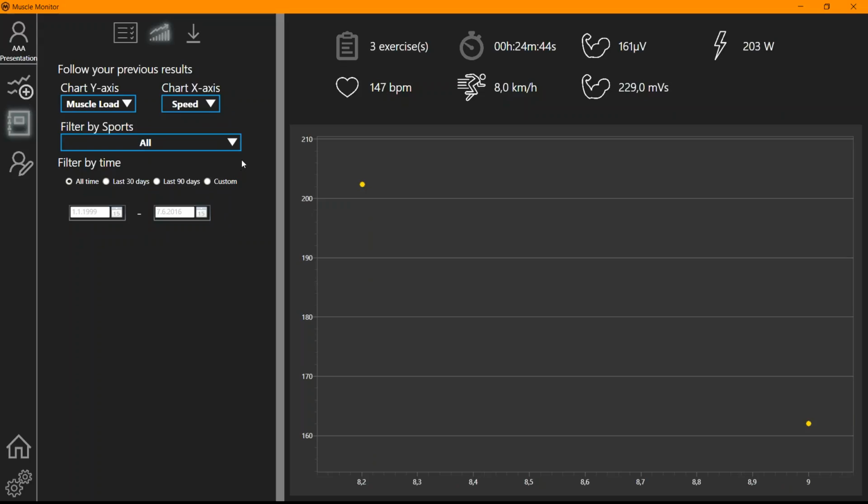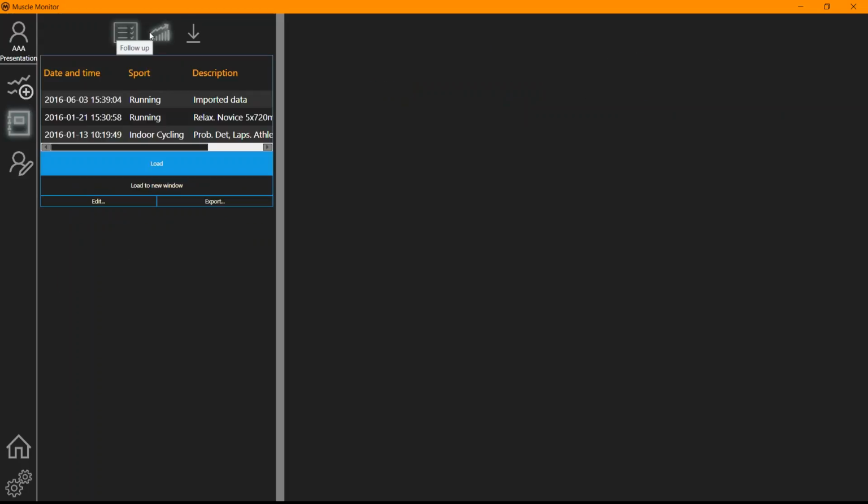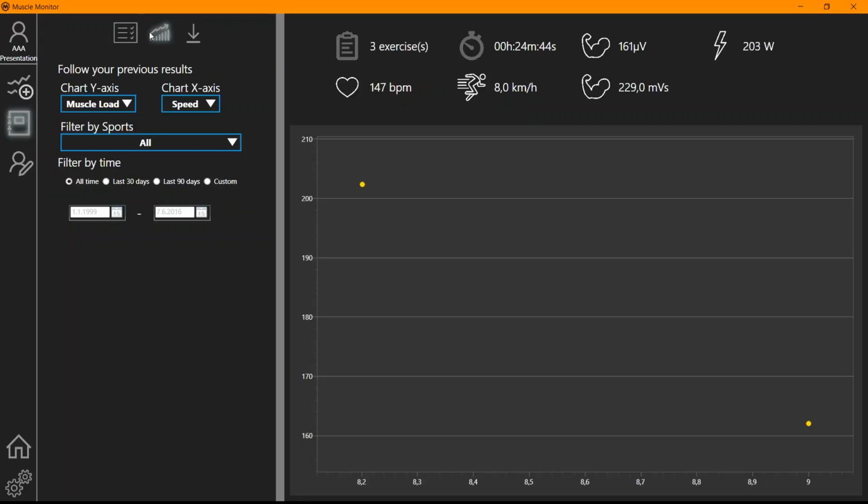Yeah, the database isn't very good to show this feature nicely, but if you have more data where you have done the same things repeated over and over again, you can see how the parameters change in the training.